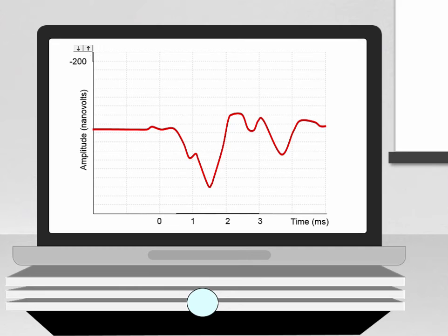The way in which you mark the waveforms in electrocochleography is dependent on which ratio method you want to use for analysis of the waveform. A separate video looks at the two ECoG ratio measurement methods, the SP-AP area ratio and the SP-AP amplitude ratio.